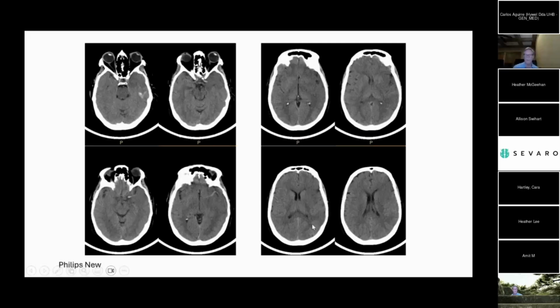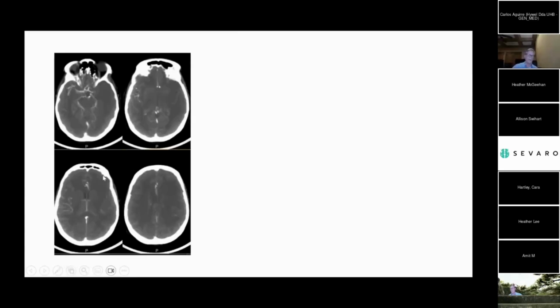And let's jump up here to where the lateral ventricles are. So the normal side first, right? We'd like to look at normal first and compare it to abnormal. Here's the cortex, shown here in white. The white matter here is darker, and you have a nice distinction between the two. On the affected side, you cannot distinguish the white matter and the gray matter here. It's all just dark. You have an island of probably normal brain, and then you have another island back here of stroke.